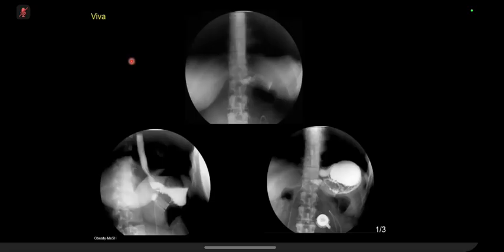It appears that the gastric band may have slipped inferiorly, with a larger portion of the gastric fundus seen above it. I'd expect the gastric band to be pointed more superiorly towards 1 to 2 o'clock, but on the second image we can see that it's pointing more inferiorly.